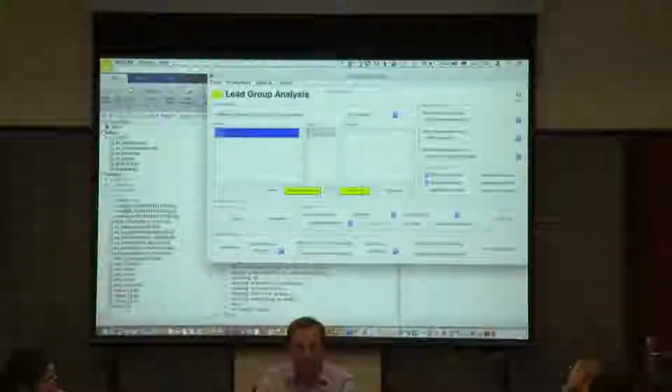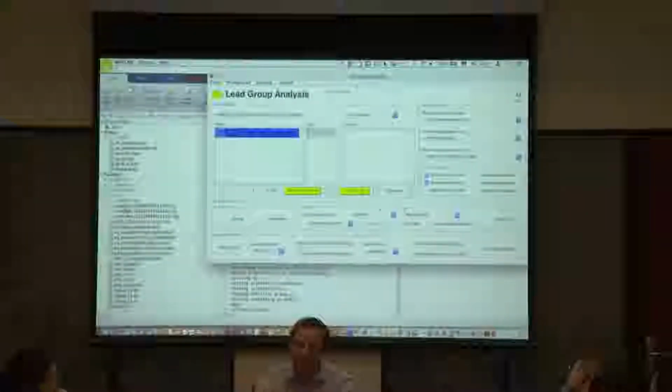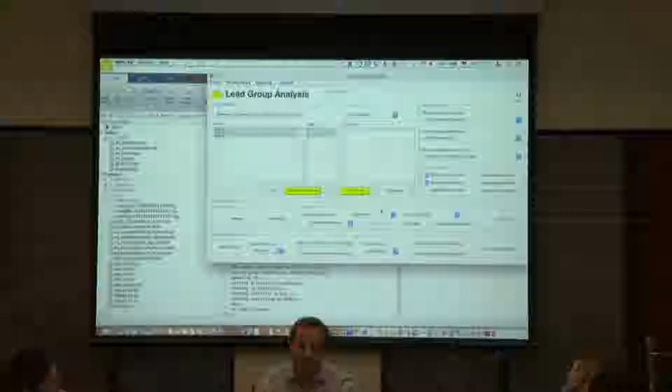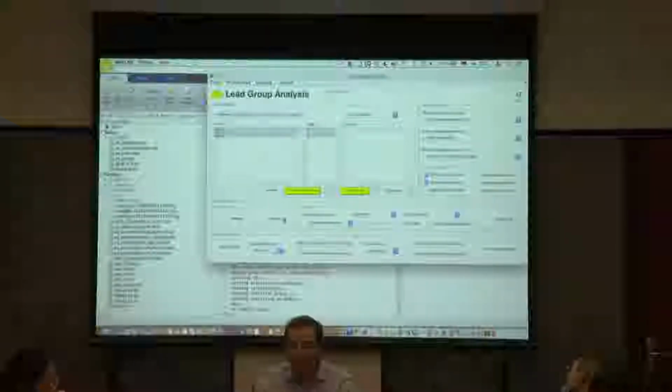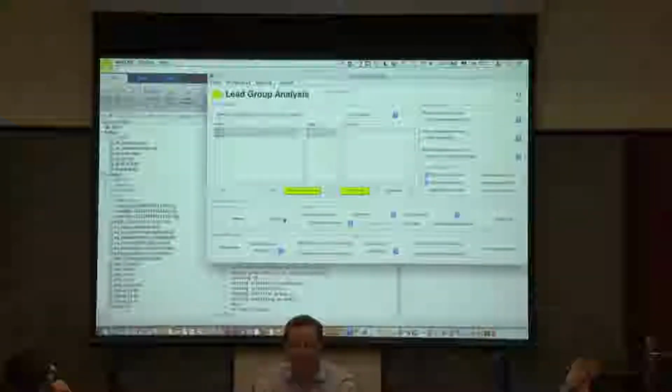Okay, so now another thing to visualize them, we said here, exactly, this visualize 2D button. And to be honest, I'm anxious that this will not work, so don't be surprised if it won't.